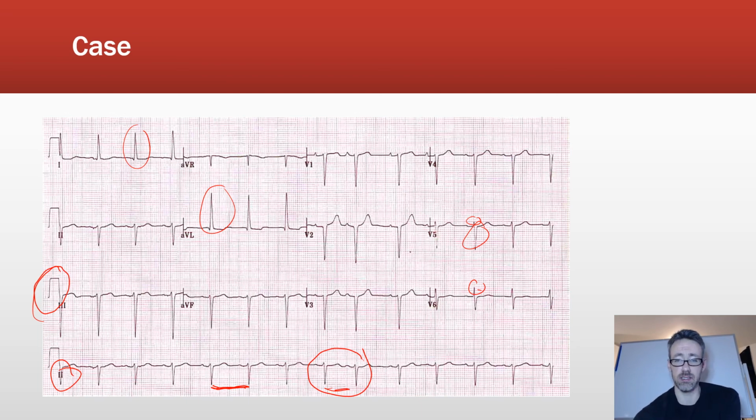It's hard to figure out what exactly is going on from that. But what we could say is that it looks to me as if we have, at least, a QS wave in V2, V3. So let's see if there's anything else there. Yeah, this looks like there could be some old Q waves in V2 and V3, so maybe some sort of septal anterior infarct that had occurred, which might be why we're seeing some changes in the normal electrical progression through the ventricles there.